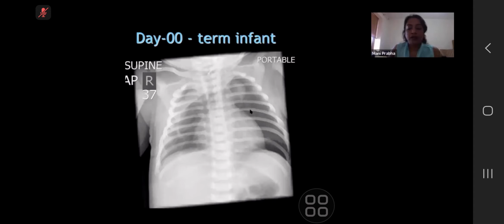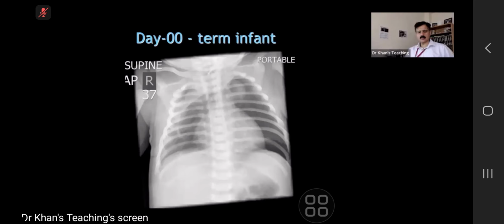Okay, so I've included it as a companion case. Just sometimes it can cause mediastinal shift also. So when you are describing those surgical conditions which we discussed just now, keep pneumothorax also in mind. That can be one of the differentials.